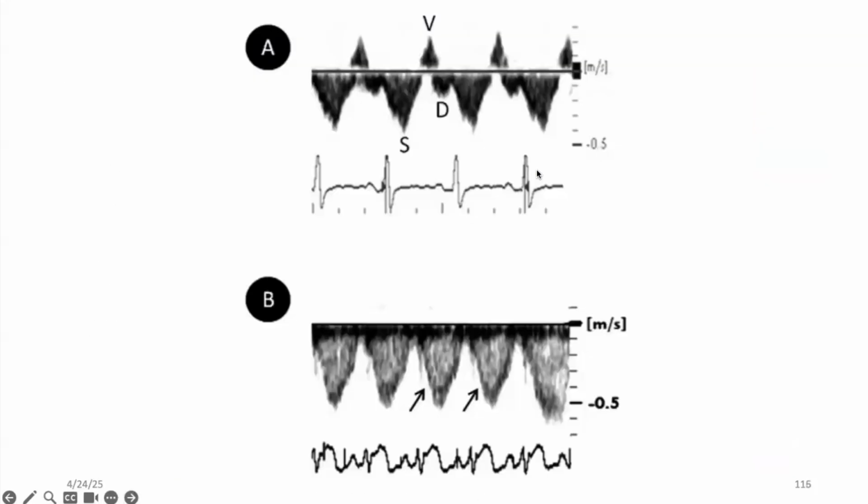Okay, quickly moving on. Tachycardia, just out of interest's sake. When you're very tachycardic, a couple of things can happen. You can lose your A waves. You can see in the top because of how quickly the next QRS is coming, the P wave tends to lie over when your ventricle is relaxing. So you lose your A wave. When it gets to really severe tachycardia, you actually only get a fusion of your S and your D wave, and you lose any retrograde flow at all.